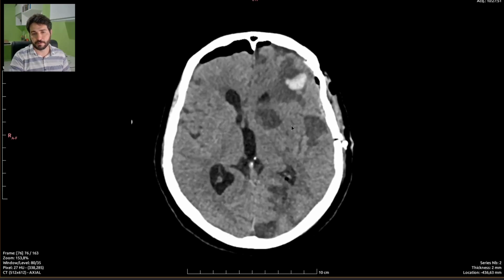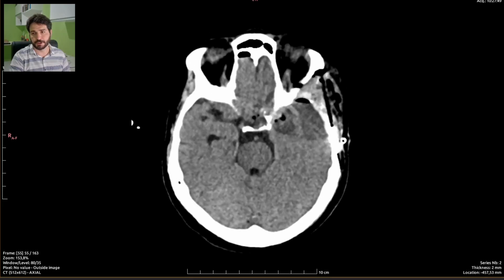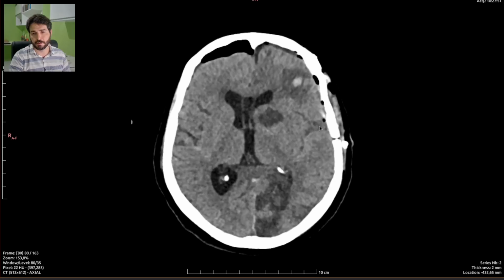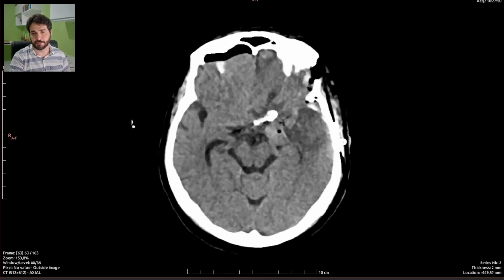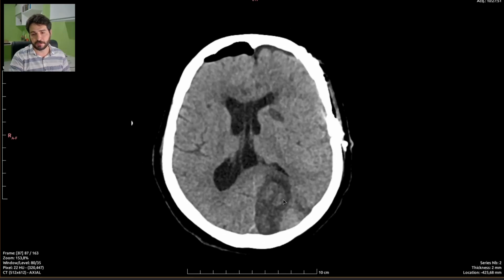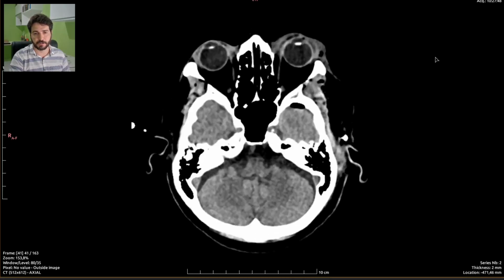There is also a bunch of acute ischemic lesions on the temporal, nucleocapsular region and frontal region of the brain on the left. Also a massive ischemic area on the left posterior cerebral artery.